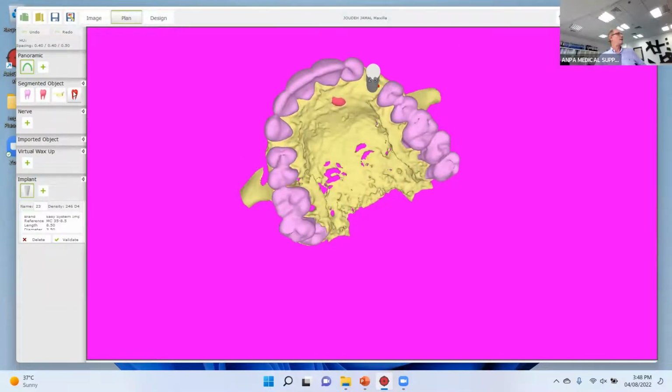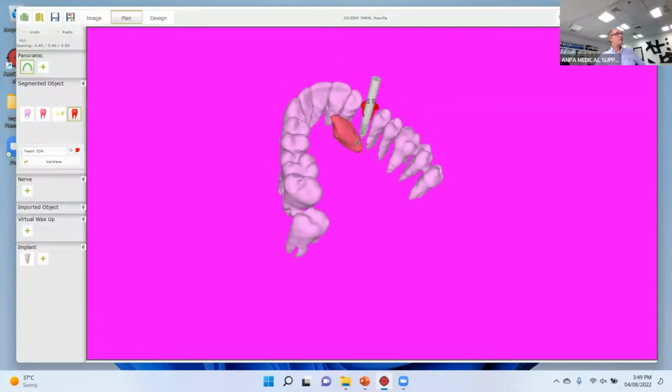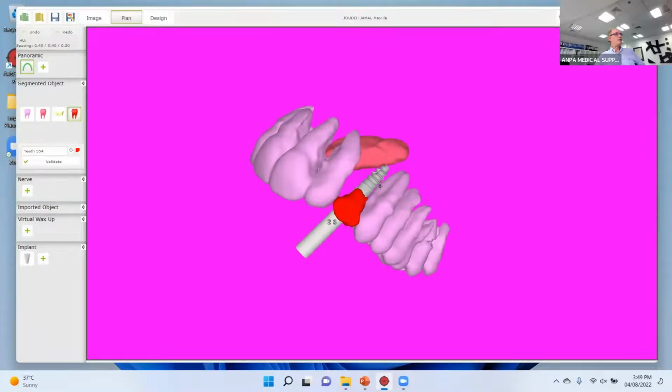So I put back the baby tooth, and the baby tooth is there. So I am emerging in the cingulum of this tooth, so I will be able to go to a screw retained lateral canine. A screw retained canine is very good for me. This is exactly what I want. I remove the bone, and then I see that I am not touching the canine. I am emerging in the right position, and I am in the good position.